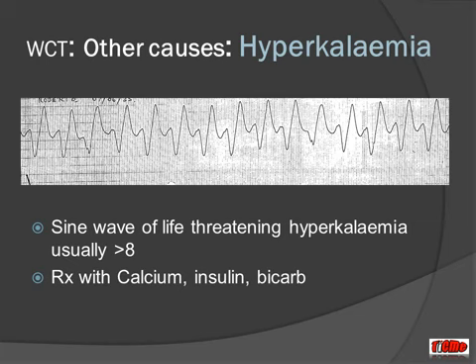The sinus node is actually quite resistant to the effects of hyperkalemia, but you do need to immediately treat with intravenous calcium, with insulin and dextrose, and in a situation which is this unwell, I would probably also give some bicarbonate as well. So remember that the wide complex rhythm in hyperkalemia, especially when it's going at this relatively slow rate here, is a sinoventricular rhythm, and the treatment is reversing immediately the hyperkalemia because it's unlikely to be fixed by cardioverting the patient.